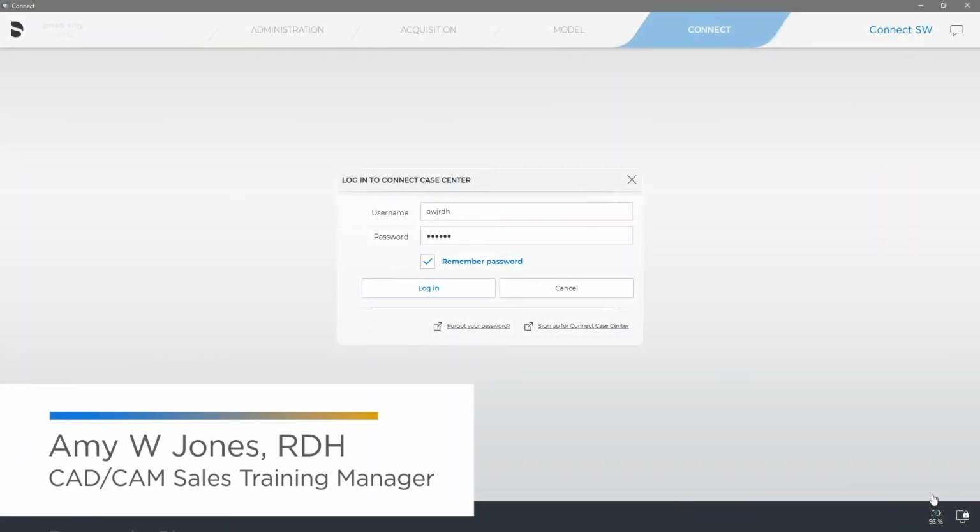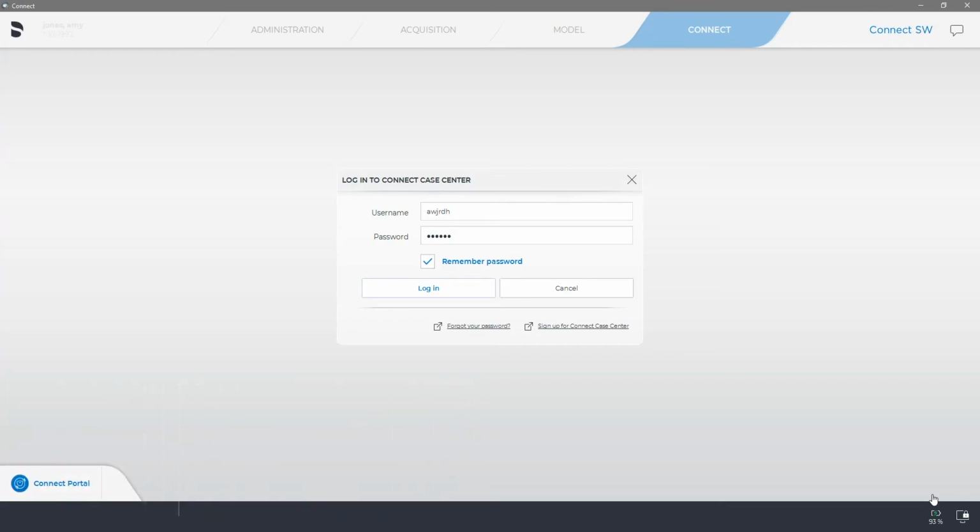We're finishing out this series on Connect Software 5. In this video, we're going to go through the Connect phase where we're going to send the case off. So we have finished everything in the model phase. We've moved forward and now it wants us to log in to our Connect Case Center account. So I've entered the username and password and I'm just going to click on Login.